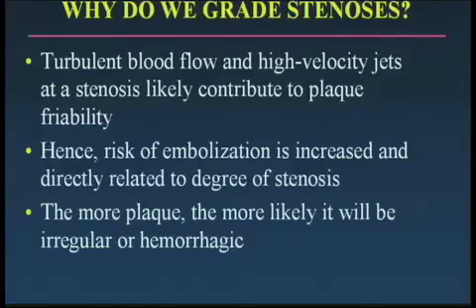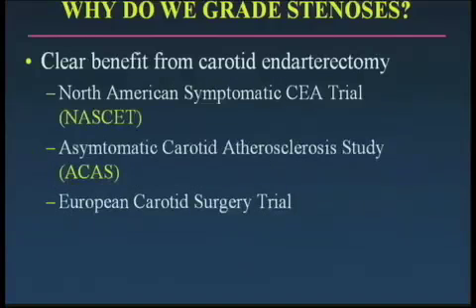In addition, the more plaque there is at a particular location, the more likely it is that it will be irregular or hemorrhagic, and that also increases its friability and its likelihood of embolization.